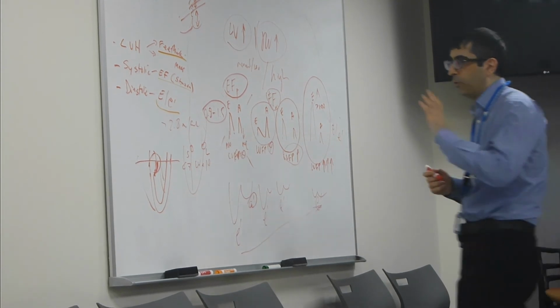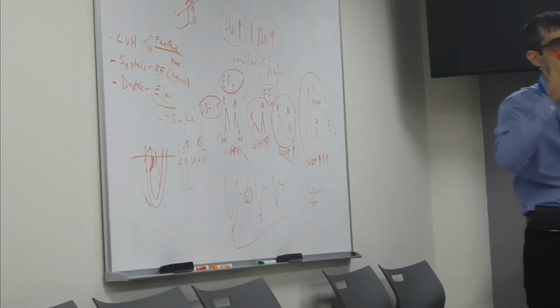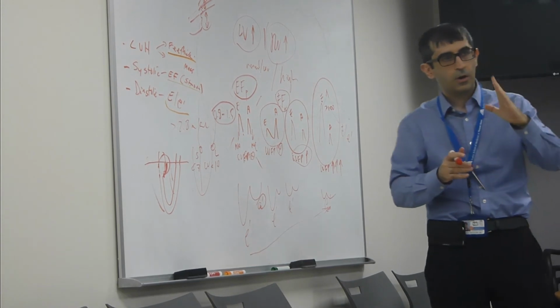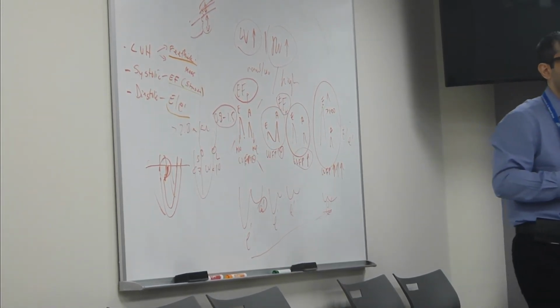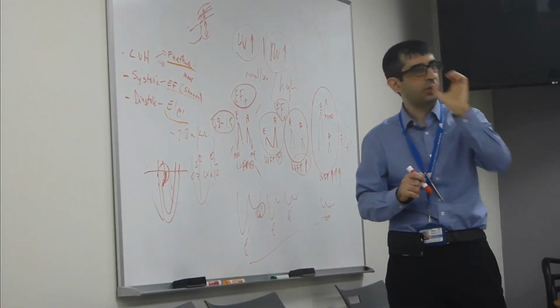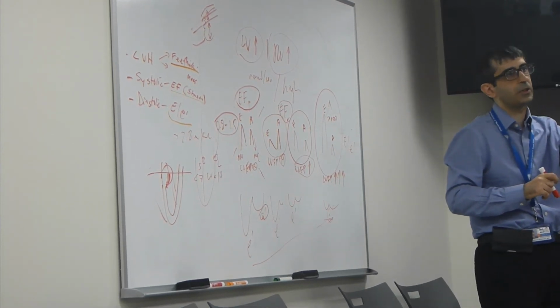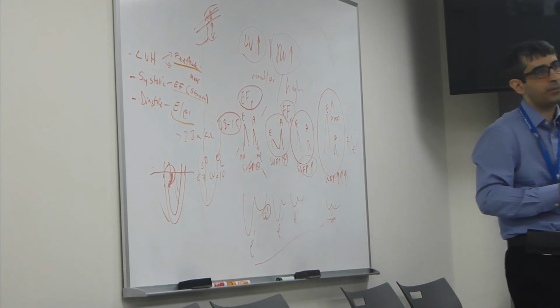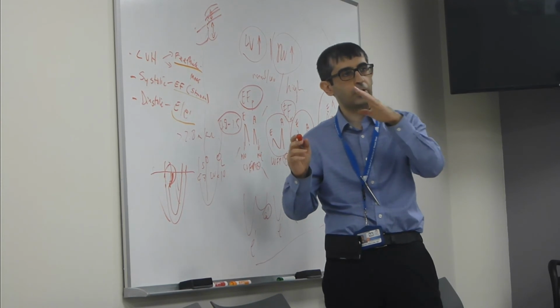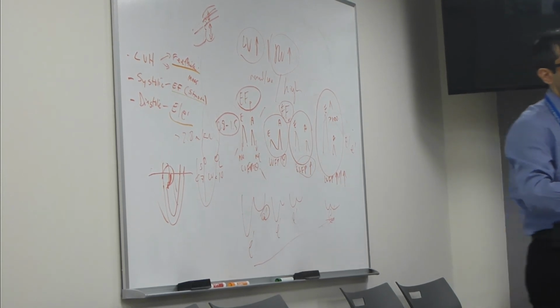When you look at the guidelines, they say measure at the level of the mitral valve tips, both the septum and the posterior wall. You see where the tips of the mitral valve are, and then measure your septal thickness and the posterior wall thickness. The problem is in elderly people, sometimes they have this prominent bulge, and the rest of the ventricle is thin. If you measure at that, you'll say, oh, significant LVH, but it's localized to the basal septum. So sometimes what the studies did was ignore the bulge and measure right after the bulge.